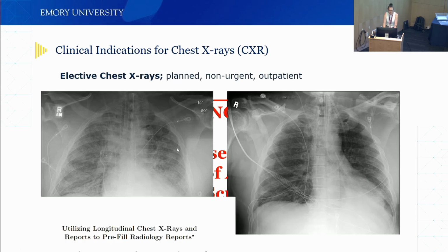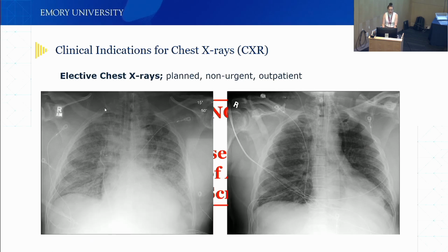So what we very often do for x-ray, we look at timeline based. So you try to look at an earlier one to see if things change. And then if you spot things that appear, you know it's an abnormality. If they disappear, you know that probably your treatment was working. So in this case, it was a pneumonia. They got treated and this looks better. So very often you have multiple x-rays. So if you want to use AI, you have to see, depending on the disease you have, if you want to use one time point, if you want to use multiple time points.